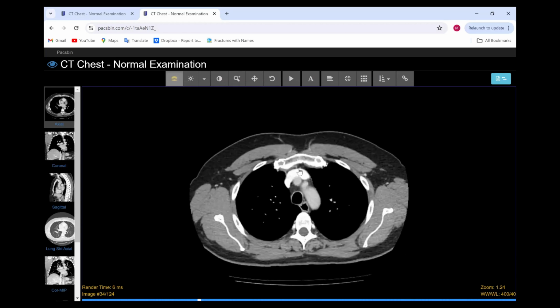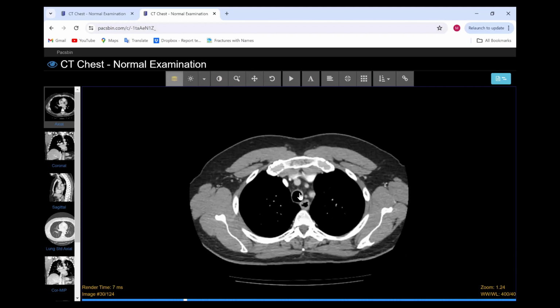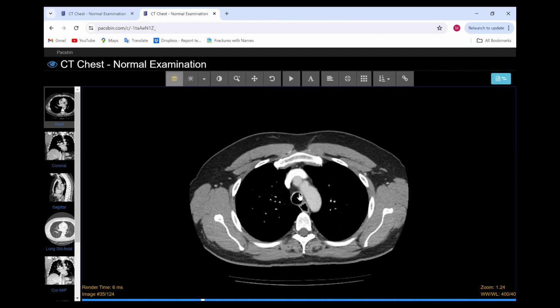We move on to the upper mediastinum, and you can see here there are three rounded vascular structures from right to left. These are called the brachiocephalic artery, left common carotid, and left subclavian artery. All of them originate from the aortic arch. The origin should be looked at carefully, because sometimes we have something called an anatomical variant. This is normal, but something extraordinary, and we should mention it in any report for future surgery to avoid any vascular injury.